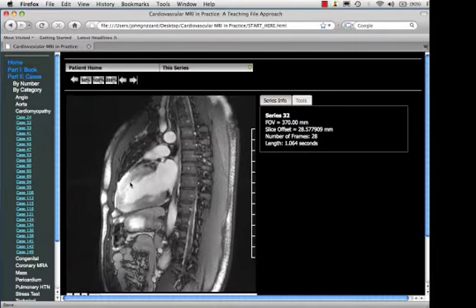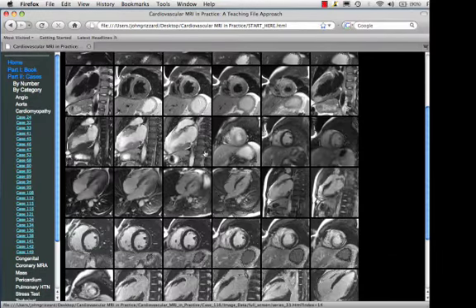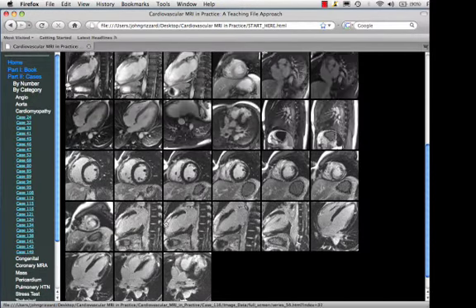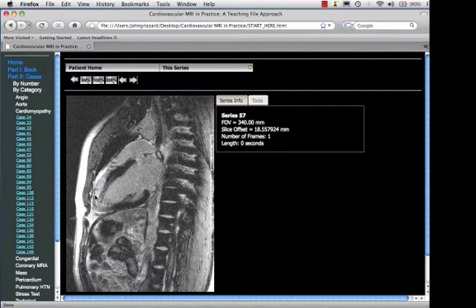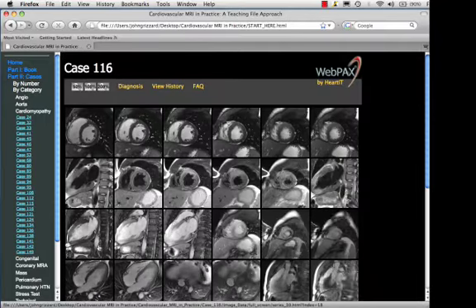Post-contrast imaging also confirms the areas of abnormal high signal with apparent increased uptake of contrast, and delayed enhancement images, as seen in this row, demonstrate abnormal uptake, which is nearly transmural but appears to spare significant portions of the subendocardium at the apex.